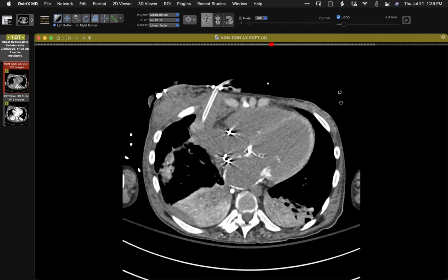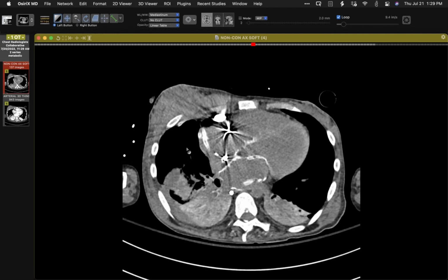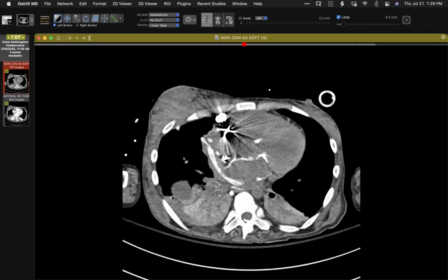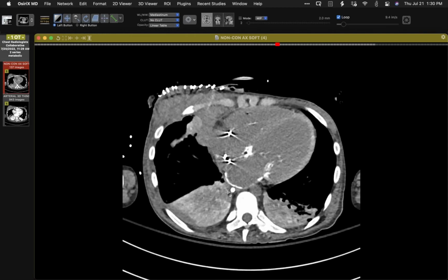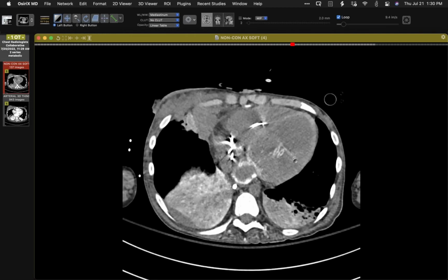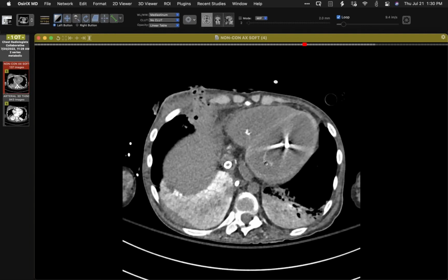I just want to clarify that this tube that you see coming in here goes via a superior pulmonary vein into the left atrium, across the valve into the left ventricular chamber here, with an attenuating object there, which is what you will see if you are lucky and look for it on a radiograph, is intentional.